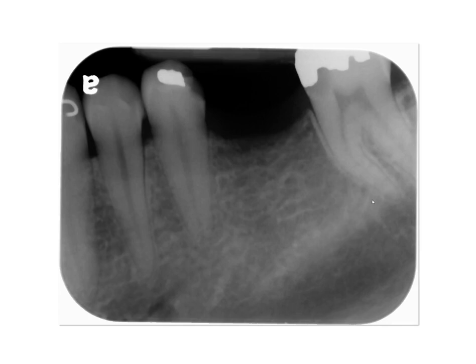Again, internal oblique ridge, which defines the superior border of the lingual undercut or submandibular gland fossa. And again, within this submandibular gland fossa, you see a channel of radiolucency that's even more radiolucent, right? Darker than the surrounding undercut area. So that represents the pathway of the mandibular canal, meaning this most likely represents the superior cortication of the canal, and here probably is the inferior cortication of the canal.